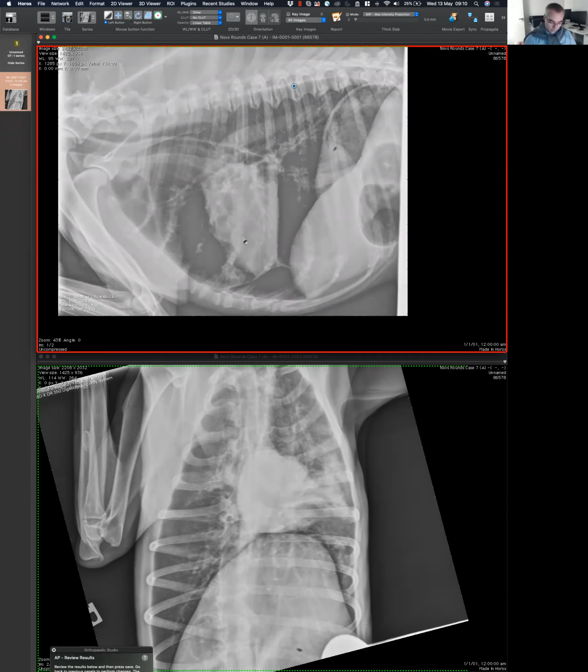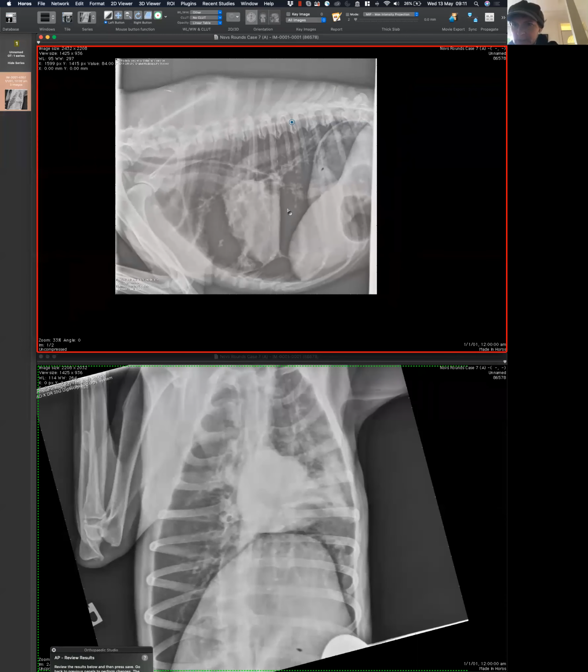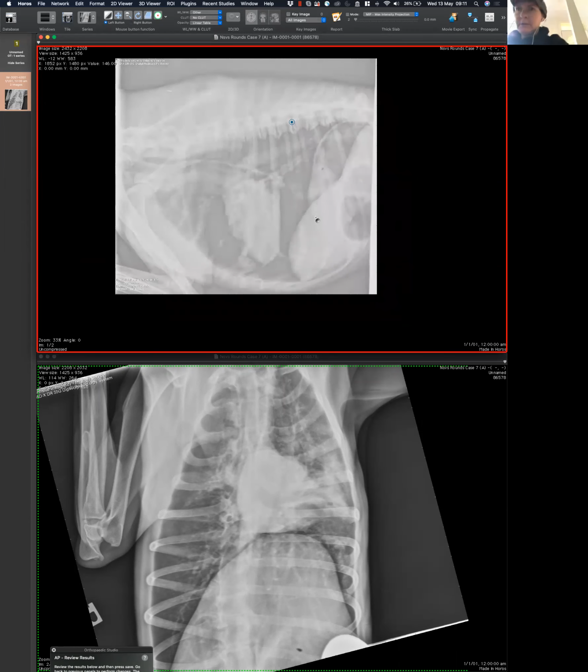Okay, good. So now you are making a comment about the technique, the exposure of the radiograph. Is that related to any of the 2 particular images, one more than the other? Do you think your comments apply to both? On Zoom, the more dorsal, the top image. Perfect. But on Keystone, the image looks normal. Well, it looks properly exposed on Keystone. Are you sure? I'll go back.